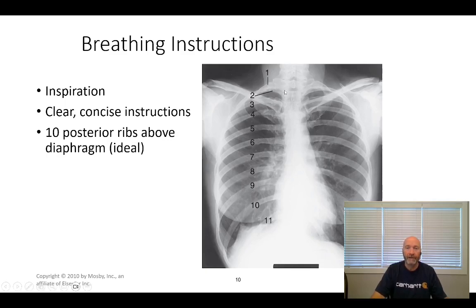So the ribs wrap around the backside of the patient and they actually touch the spine in 2 different places. So you've got connectivity between the rib and the spine. So if we just pick a rib, this is a 6 rib, and if we wrap around, you can see that the rib turns and it just kind of disappears right there.